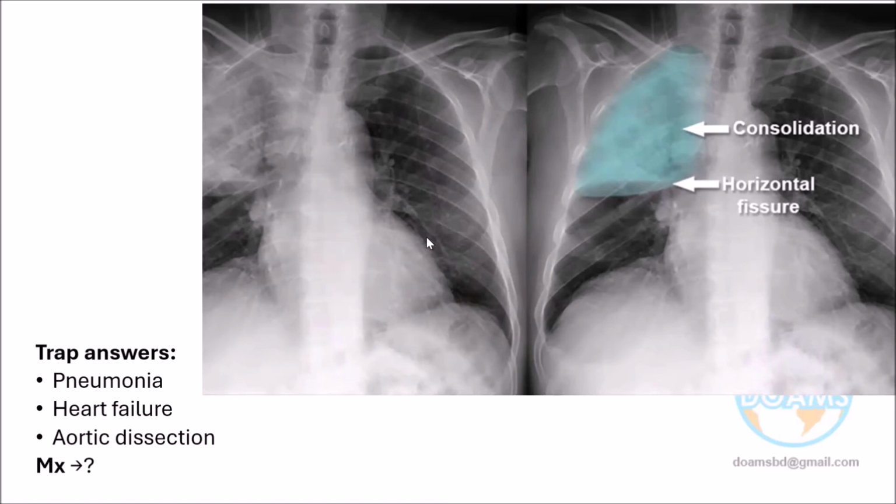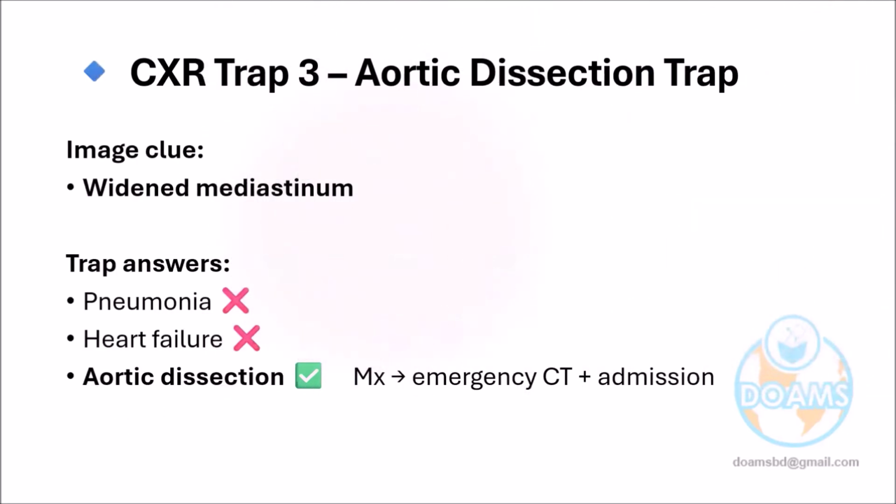Aortic dissection appearance will be a little different. Aortic dissection could be a complication of hypertension. It is very, very true. So I'm not saying this X-ray is not pneumonia. Rather, be careful about a widened mediastinum at that time. Try to identify aortic dissection. Don't be confused. In this type of X-ray, straightforward, this is pneumonia, no doubt. Then your emergency treatment plan will be there.